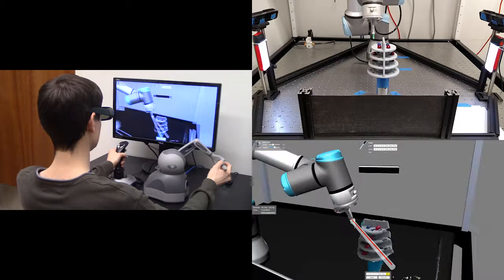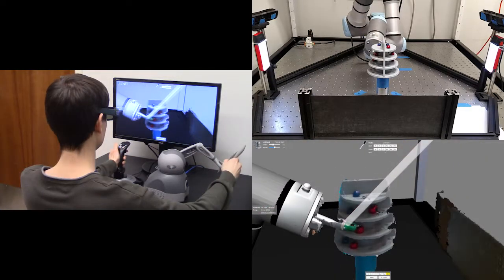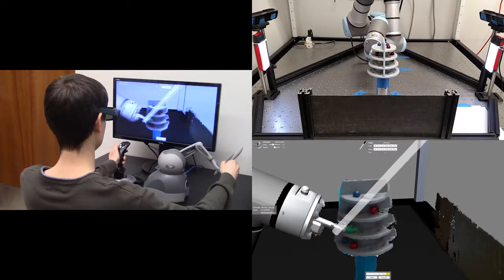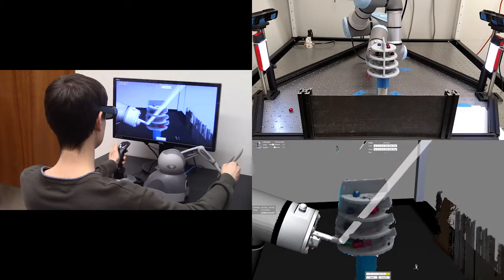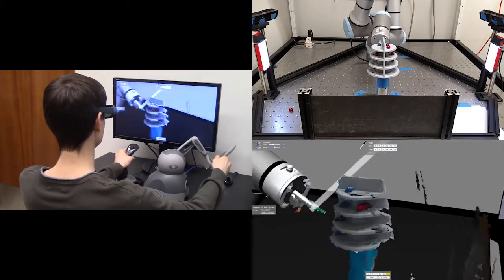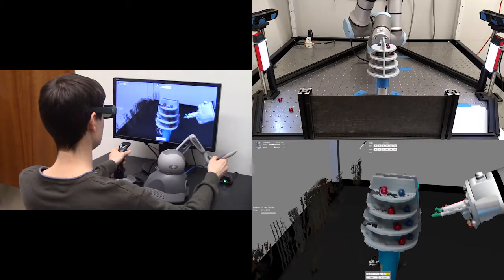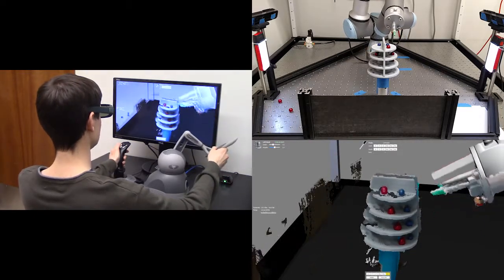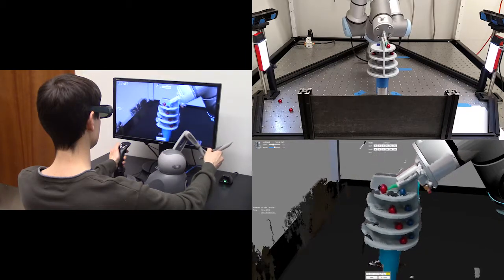Here the user takes advantage of the 3D imaging to view the test structure from the side. They then proceed to complete the scenario's objectives. The user is free to change viewpoints at any time, as ergonomics or the scenario dictates. Here the operator rotates their view to visualize the objectives on the opposite side. They can do this without compromising their ability to control the tool.